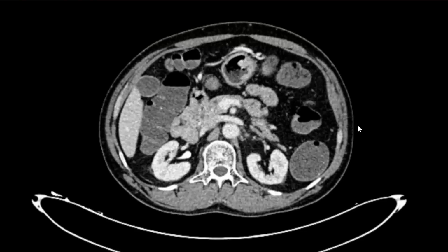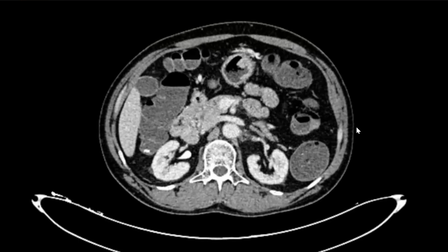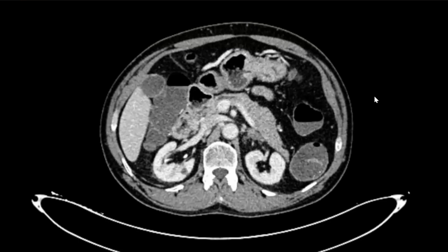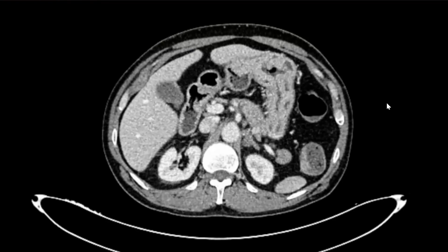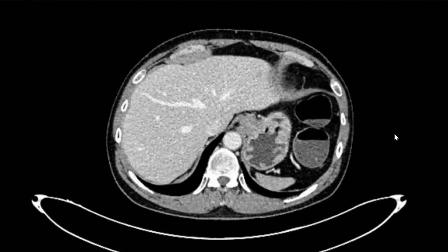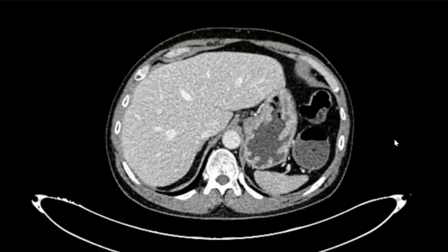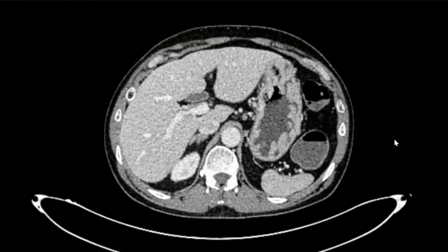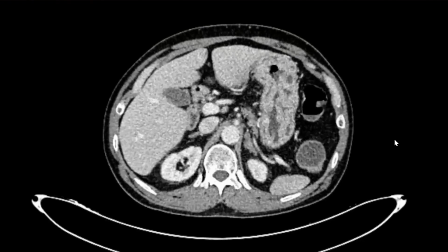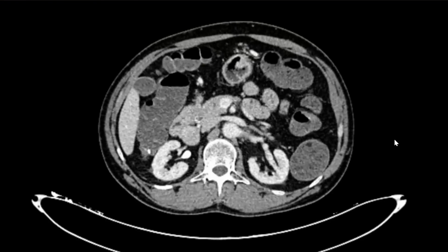You said that the gastric folds are prominent. What are you thinking along the lines of? If it is epigastric pain, then it could be due to gastritis, and gastroesophageal reflux. I could not see any abnormal focal or diffuse thickening involving the stomach, so carcinoma is ruled out.